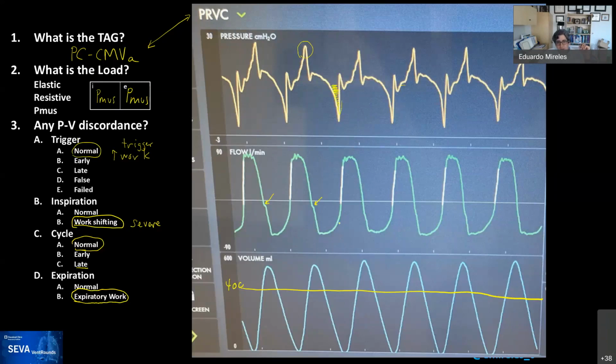And you can see how it crosses, there's no delay on crossing, actually it's triggering even before. You can see the changing color before it reaches the peak flow. So the patient is triggering and the machine is actually pressurizing relatively fast. When it's pressurizing slowly, you expect something to look a little bit more like that, or I mean, I'm probably exaggerating, but something like that.